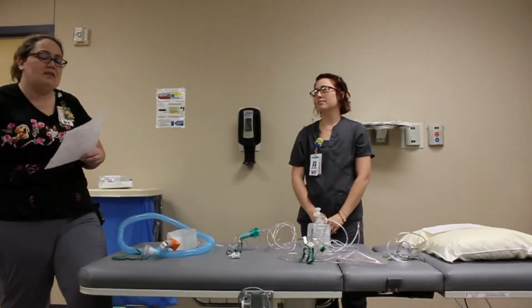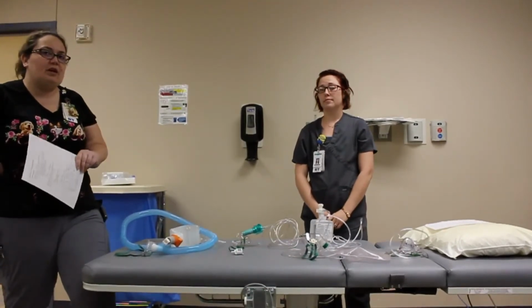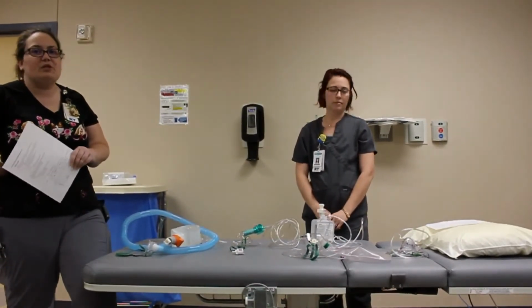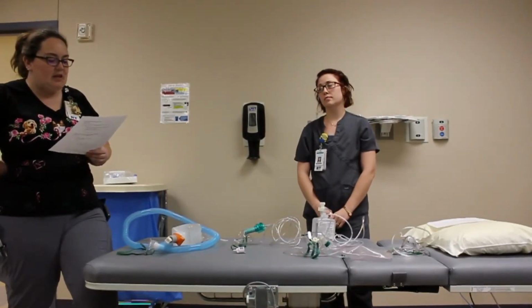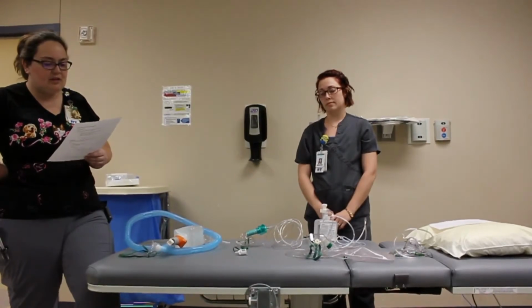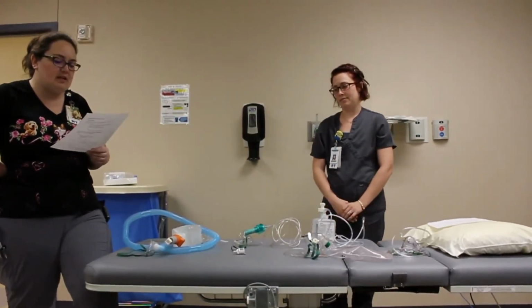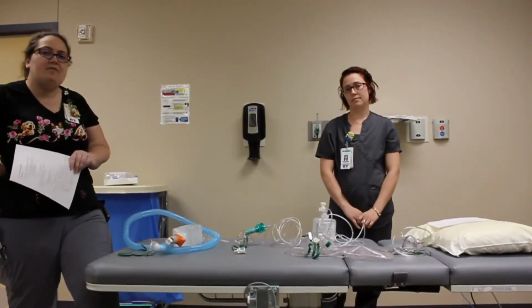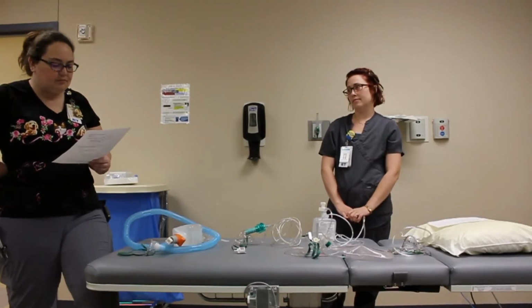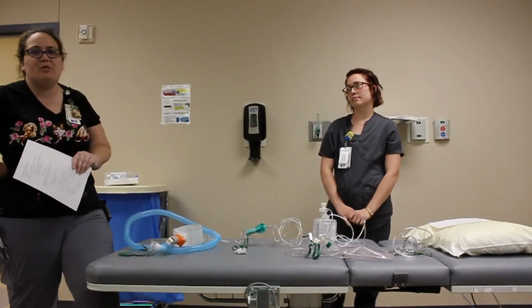When to call your RT? Well, anytime a change is made to your flow or FiO2, an informative call to your assigned respiratory therapist is appreciated. Your RT should be called and will immediately come to the bedside if your patient is needing to be bagged, you've provided initial troubleshooting and the issue is not resolving, the patient is deteriorating in status or vital signs, or the patient's tracheostomy tube has come out and must be replaced.